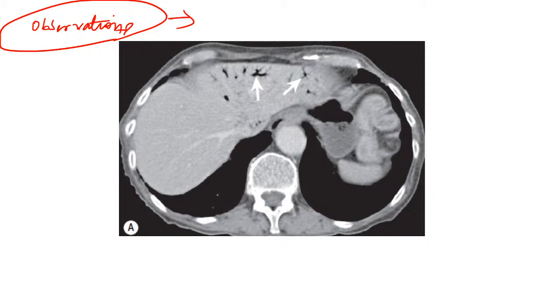What are your observations in this case? What are you able to see, guys?